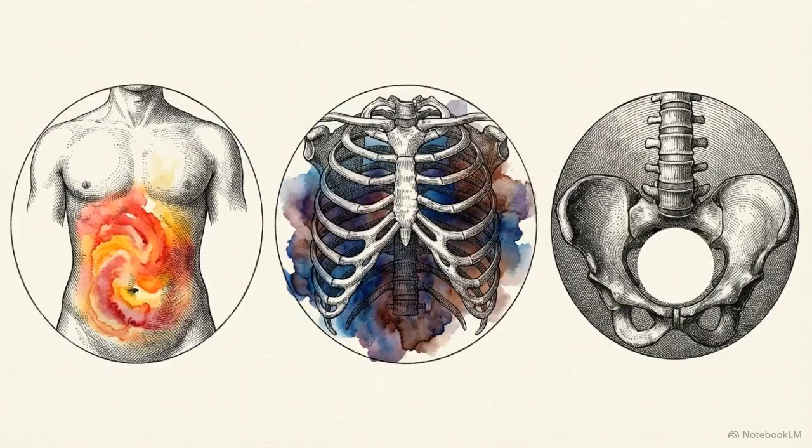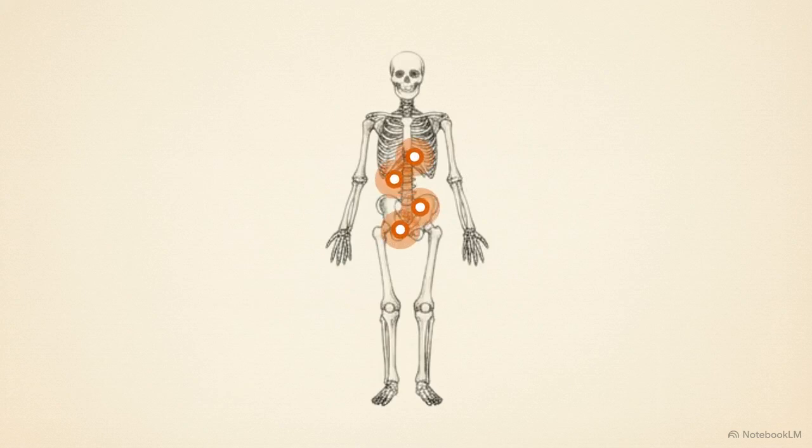Whether analyzing chemical artifacts, healing flares, or competitive binding in a Superscan, diagnostic rigor requires looking past the immediate bright spots to interrogate the systemic kinetics of the radiotracer.